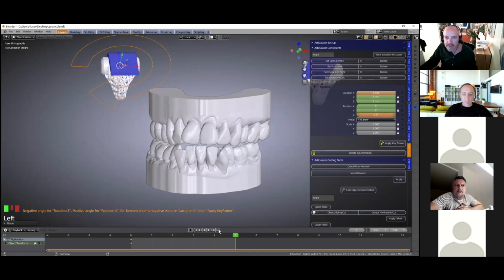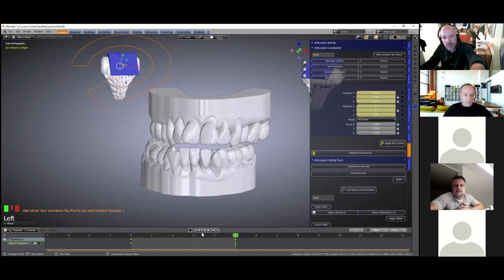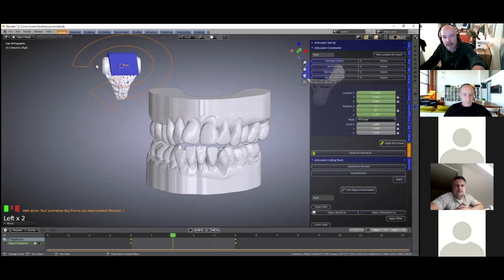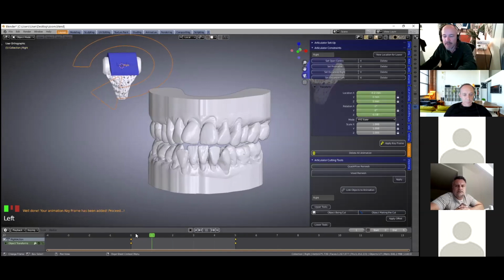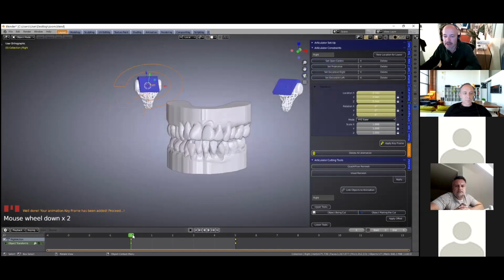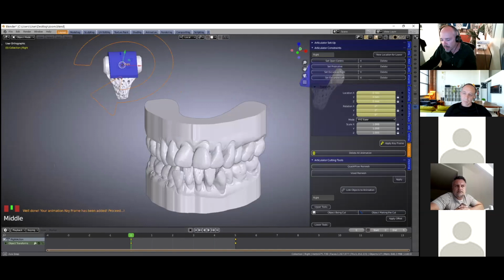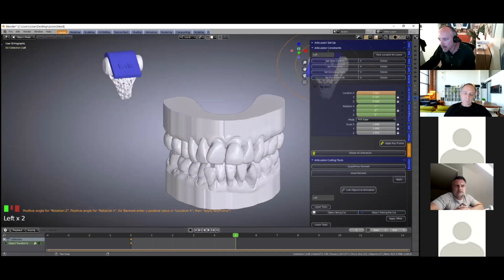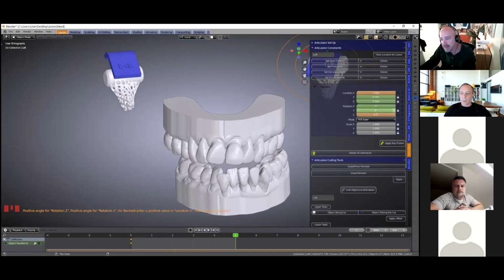What that does, on the top, the jaw moves to the left-hand side up here, and the jaw shifts at the same time. And of course, it moves down the condyle like this. We'll do the same for the other side. I'll put a +1 here, and we're going to shift it on the Z value. Once you know which ones to adjust, it becomes very easy.